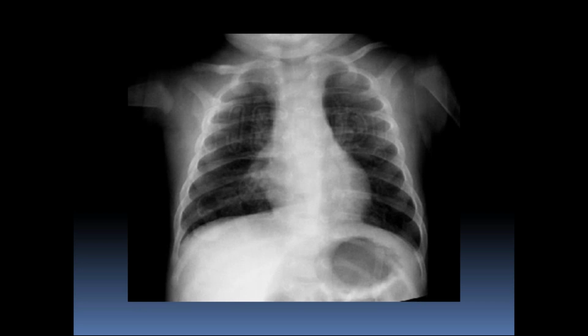All right, switching gears. This is just a little bit of a break here. I had this case in the ER not too long ago. Pediatric patients have a hard time communicating with their physicians because they can't talk, but this one clearly was able to say that they were having a little bit of a problem, and if you pay attention closely to the letters across his chest, here's the H-E-L-P, and the guy was screaming help, just basically on his chest, as far as the chest x-ray. So I thought that was kind of fun.